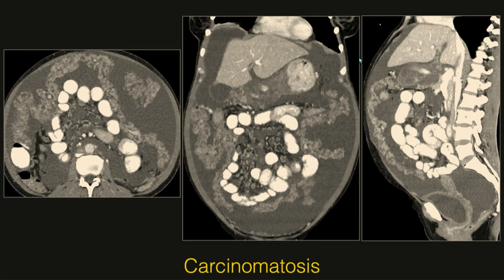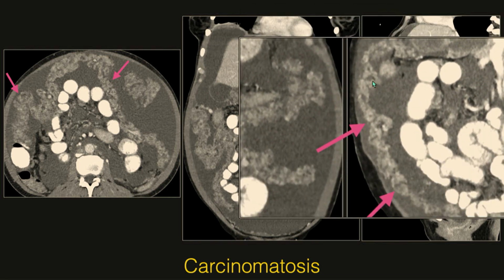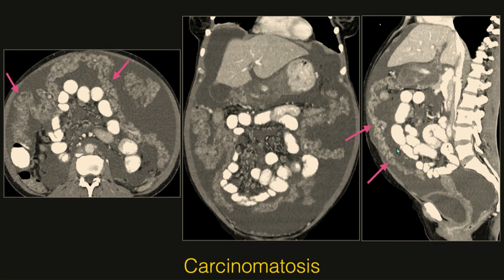And of course, carcinomatosis in a more impressive form can be illustrative. So here we have probably the worst omental cake that I've seen, where it's like ribbon-like infiltration of the whole omentum, and then you get a sense in the sagittal of that typical omental draping over the small bowel. Although I'll just warn you, when you're looking at cases of these, you're not always going to see that kind of typical Netter-like anatomy, but it can be helpful when you do find it.